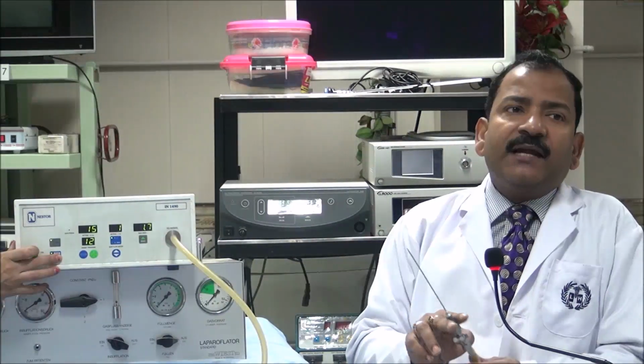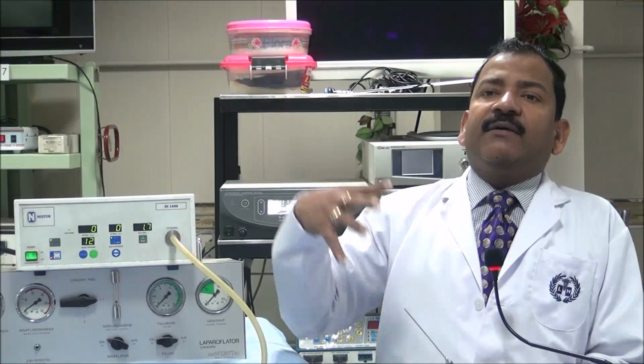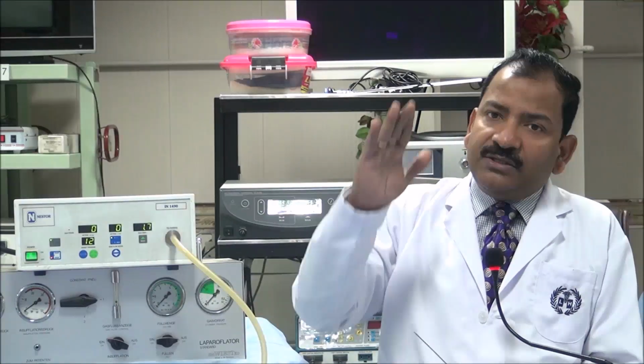Because in pulsatile mode, it synchronizes with the diaphragmatic movement. When the anesthetist is inflating, the diaphragm goes down, and at that time it stops. And once the gas comes out, the diaphragm goes up, then it puts in the gas. And slow insufflation is always better because the patient has time to get acclimatized to the increasing pressure and there will be no vasovagal shock.